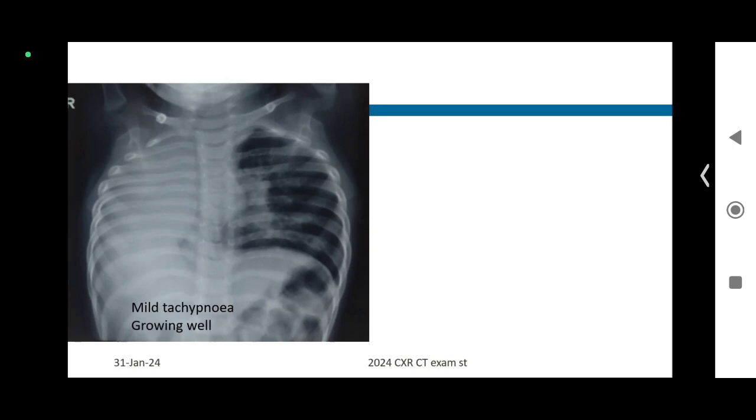Foreign body. I can appreciate that you are thinking it is an atelectasis. Very good. But you have to look at the aeration. There is no lung on this side, whether it is an atelectasis or an aplasia, agenesis. That means lung has not developed. If there is going to be an atelectasis, most of the time they will have some sort of respiratory issues.